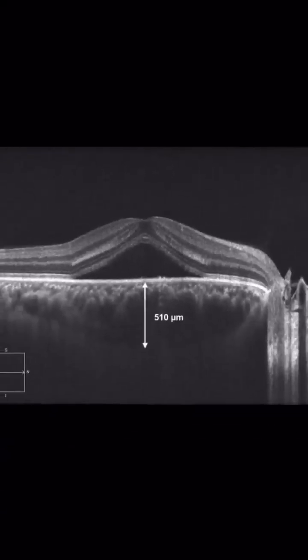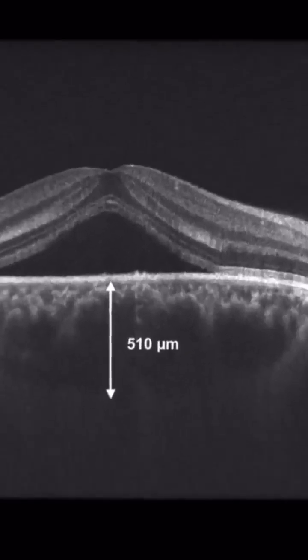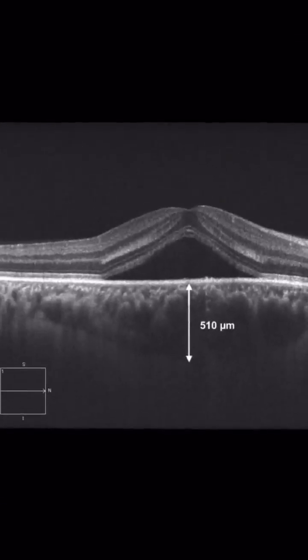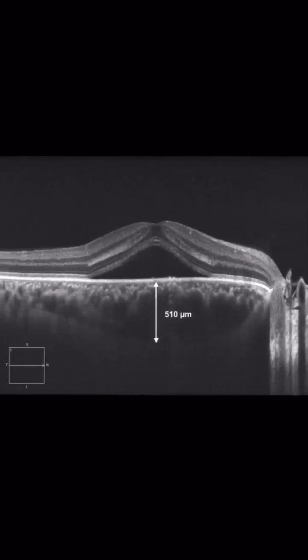This is a patient with CSR, central serous retinopathy. And we know that those patients have what we call pachychoroid. That's when the choroid is too thick and it causes leakage below the retina, and that's what causes the fluid to lift up the retina, right? Typically we used to think that the good thickness of a choroid is when the choroid is about the thickness of the retina, more or less, just so you have an idea, okay?